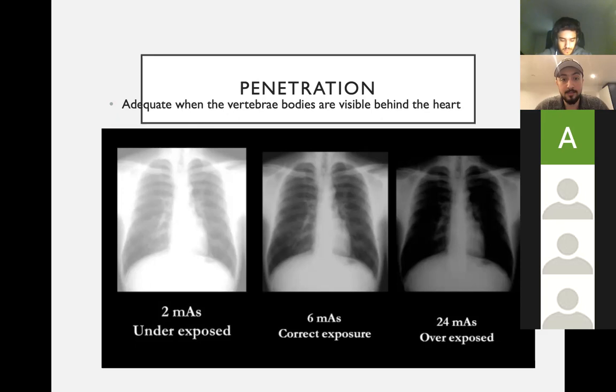So this is the penetration of the X-rays. These are the three things you want to make sure you analyze before even seeing if there's anything abnormal in the chest X-ray.